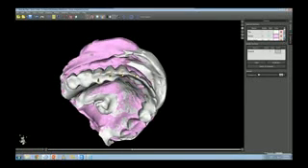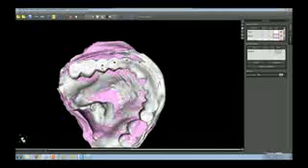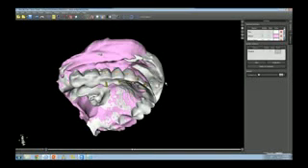So that was in the mesial distal dimension. And then buccal lingual, I'm able to see exactly where these are. The center line of the implants are in the center of each bicuspid, incisal edge, incisal edge. So that was the first phase of planning.